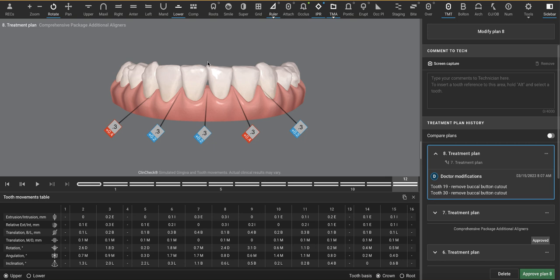Fortunately, if we do IPR, we can create space and then squeeze the teeth together, in essence bringing the roots closer together, which will hopefully squish the tissue and the bone interproximally to a more incisal level. That's a topic for a good perio-ortho continuum. Just know that when we do IPR, we can close black triangles to some degree based on a similar concept.